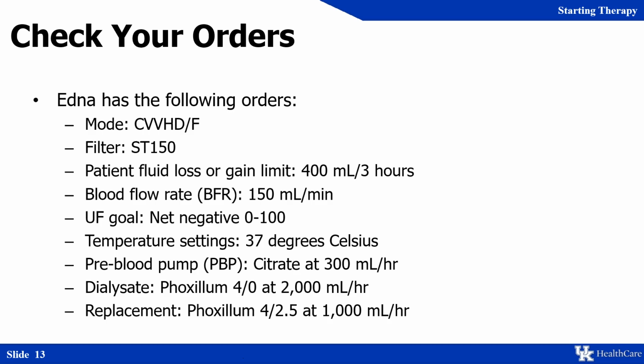This is really important because if you have a bag clamped, it's not going to lose the weight that it needs to as that fluid is pumped into the set, and in the patient side, the PFR pump, the yellow pump, is going to take that fluid off and pull way too much, because again, the machine is not going to take off any more than it puts on, but it can't take off fluid that it never gave. So this is just a safety feature. You really don't even have to change it.